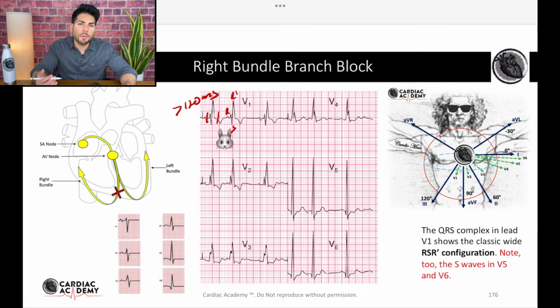If you remember from our previous lectures, the R wave progression starts more negative and becomes more positive as the wave of depolarization travels from V1 to V6. And you can see that here. So you see how it starts more negative than positive, and then as it progresses through the precordium, it becomes more positive. You can see that here.